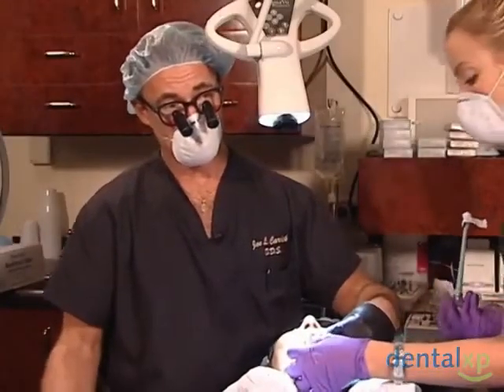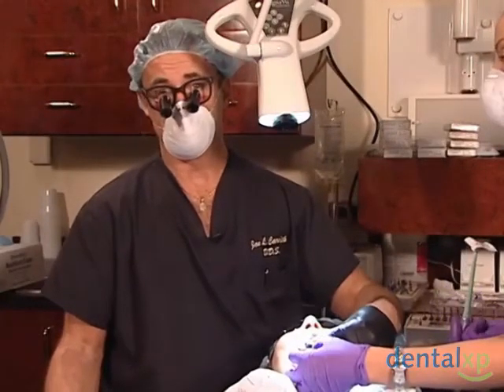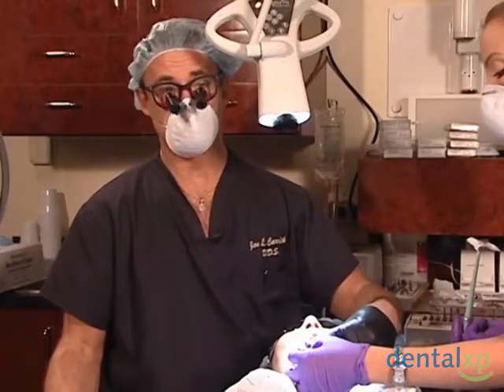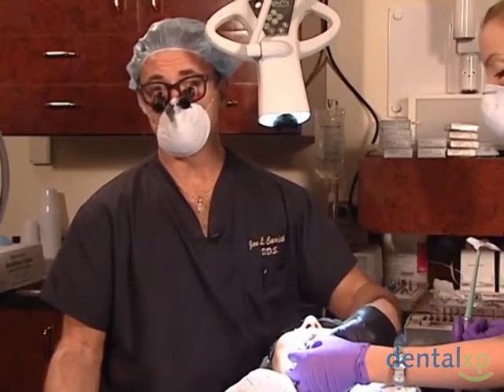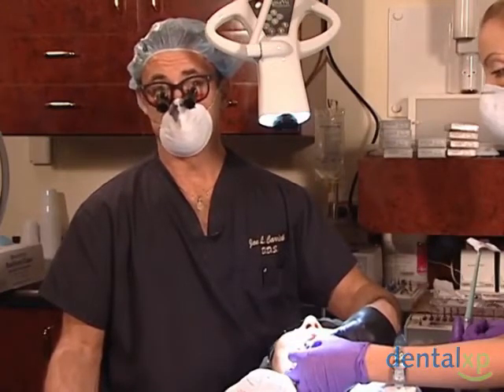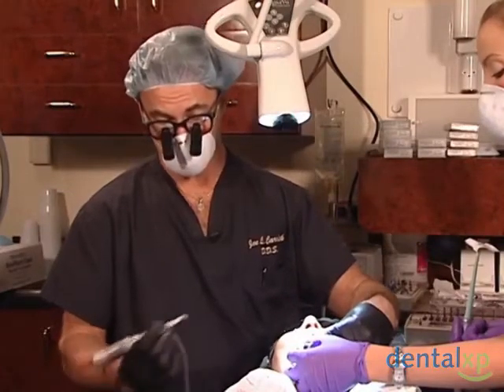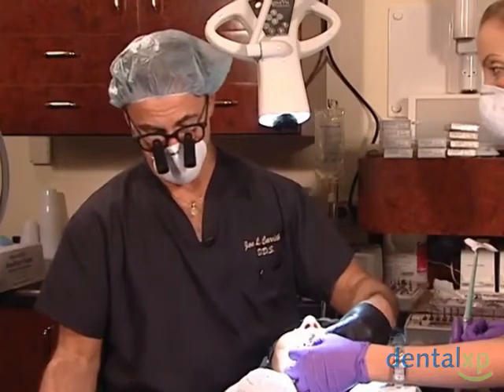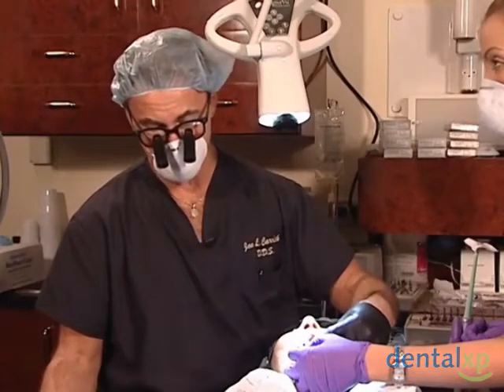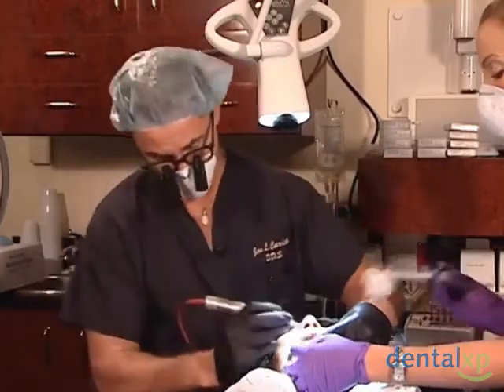Also with the system, it takes into account the soft tissue. The other systems that are out there, the other types of CT scanning, will go ahead and make a hard copy, a model of the bone, but they don't tell you the compressibility of the tissue. So if you have extremely compressible tissue and that moves maybe 2 millimeters, you can readily see that now you have a 2 millimeter error in your guide. So with this system, since the CT scan was taken with the same appliance that is now the CT or surgical guide, the tissue is compressed equally both times.